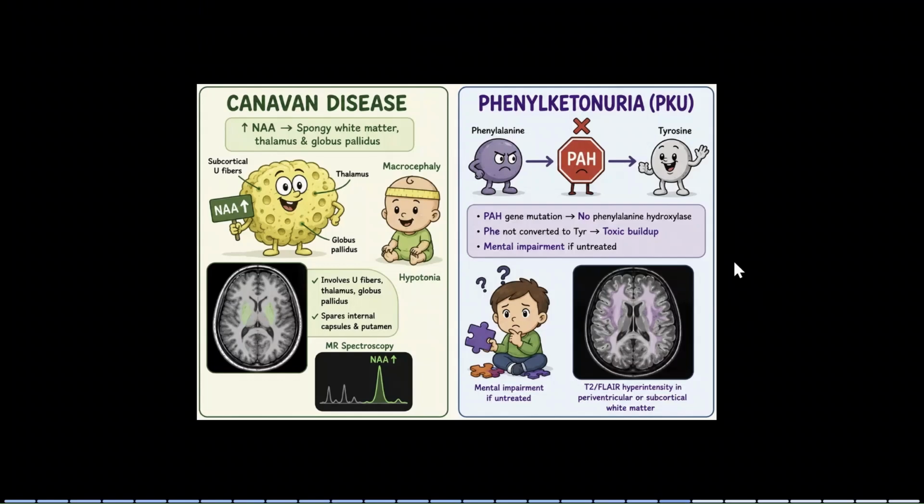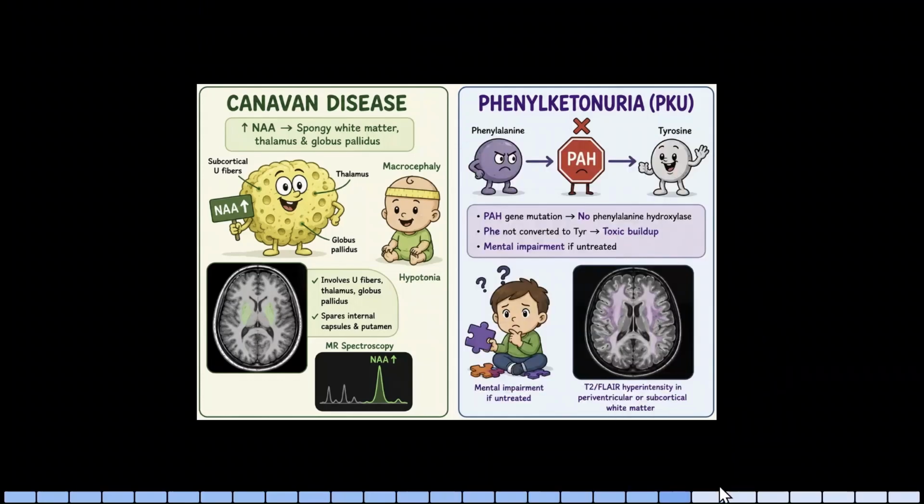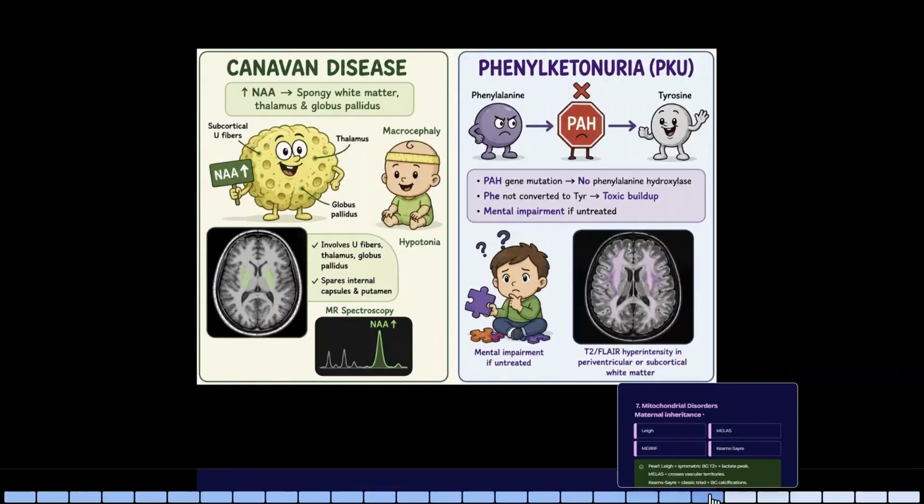So this is the clue, and here is another image for remembering these two. These are simple and easy, and often come up in exams.